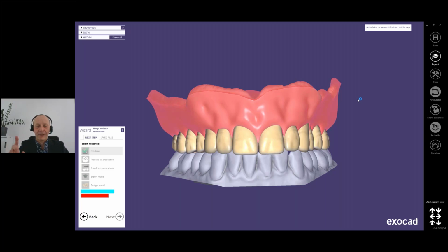The second important thing, please don't forget to save the scene before exit. If you don't save the scene, you save only output data, but you cannot rework your project later on. This is a small checkbox. And don't forget to check this checkbox. One second.